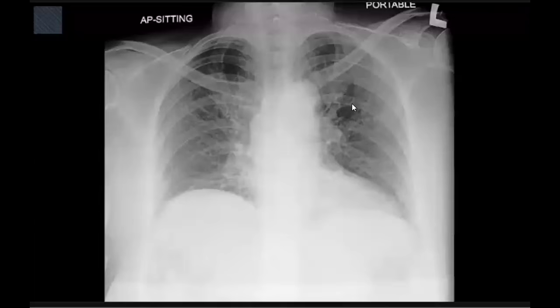So, other possibility. This patient presented with right hypochondrial pain and fever. I can see some opacity and calcifications in the right hypochondrial region, with some hyperdensity within it, and some lucencies are also noted.